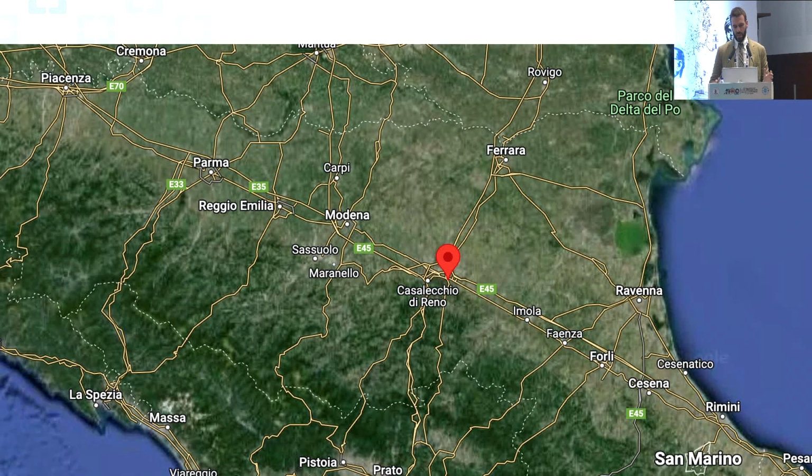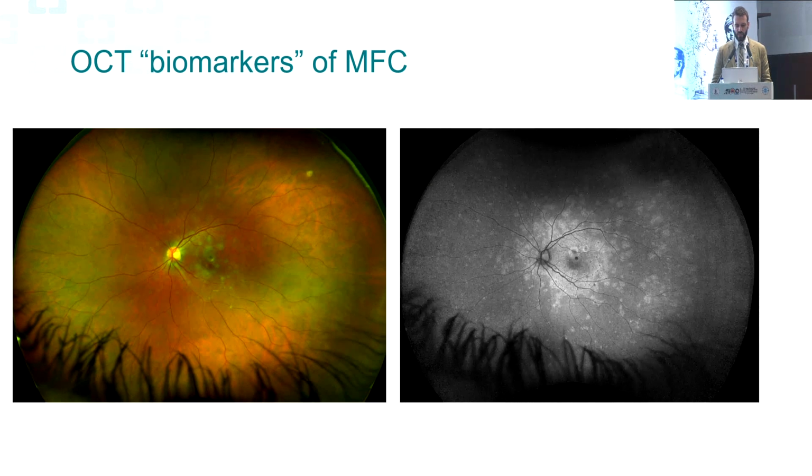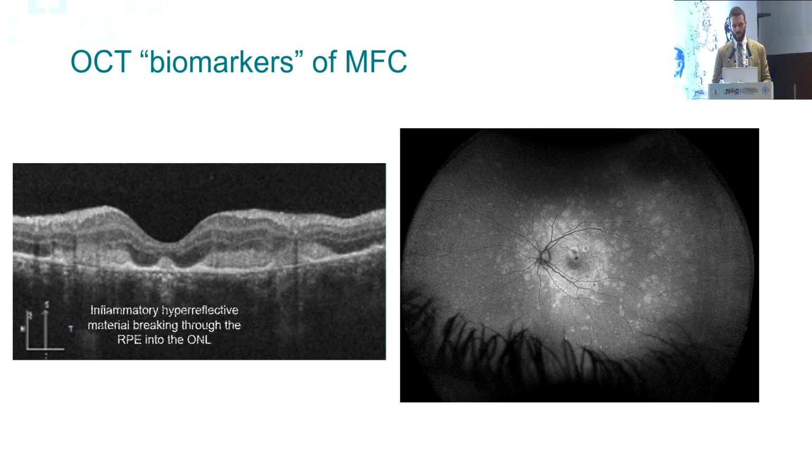Now zooming in, you know I was born around that area. You have some telltale cities here, some autoroutes, so you could find out where I was born. And this is where we took OCT next. We were looking for biomarkers of our disease. So in multifocal choroiditis, for example, with OCT, you can find some telltale signs that are telling you this could be multifocal choroiditis.